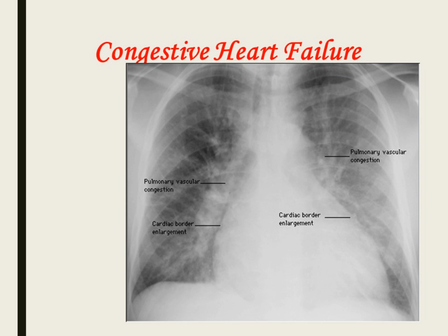We see consolidations, lots of pneumonias, all that stuff. The other one that we see is pretty much edema, somebody with CHF. Things we look at: A, airway; B, bones, look good; C, heart. The heart is kind of big, right? Is it bigger than half of the thorax? Yes, it is, so the patient has some cardiomyopathy. The right cardiac border is also enlarged, which tells you the right atrium and right ventricle are enlarged, so we can see that in people with pulmonary hypertension as well.